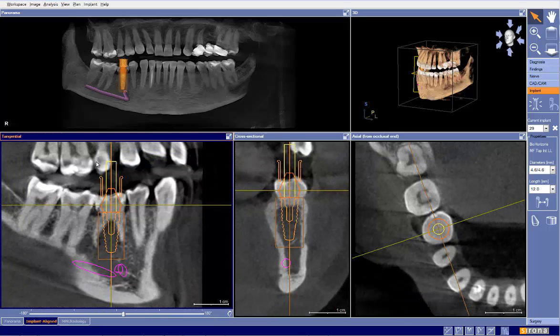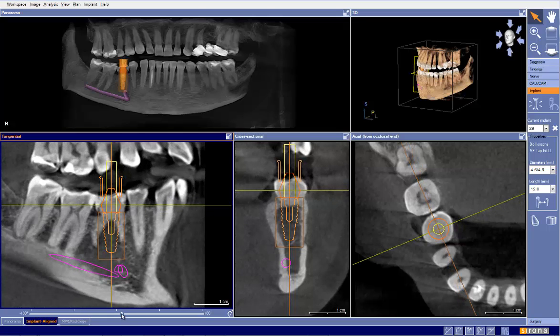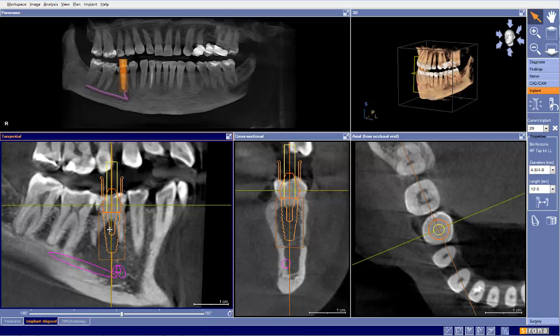If I were to critique the plan, the only thing I would probably critique on it, well, the two things, one minor and one a little bit more than minor, is I would probably critique that my occlusal plane is going a little bit up more than I like it, so I would probably just adjust this plan like so and center that back up. But that's a minor critique.